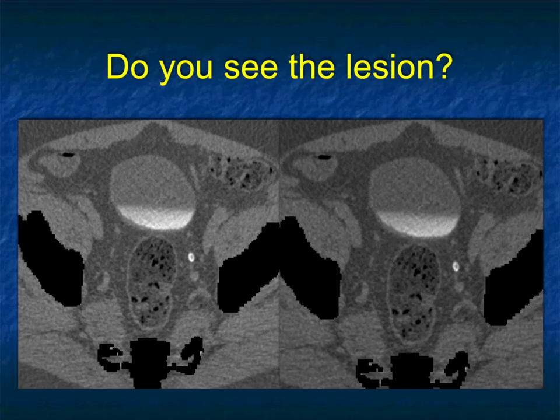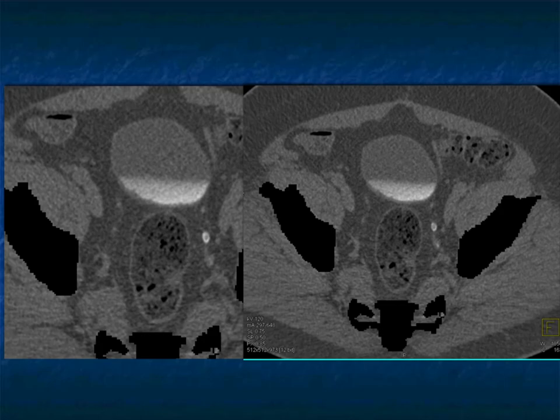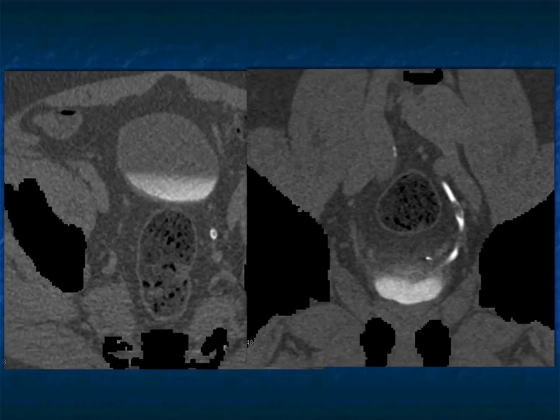Here was a patient where we're looking for hematuria. We were taking the bone away, and I noticed the ureter here, which is not dilated, looks like a donut. If you look at that more carefully, what is in that donut? It's actually a small tumor in the ureter. We always like to think about ureteral tumors. You'll see obstruction, so the ureter will be dilated. You're looking for transitions from normal to dilatation. But this case shows you very nicely a 2-centimeter mass did not obstruct the patient's ureter. If you weren't careful, you would miss it.